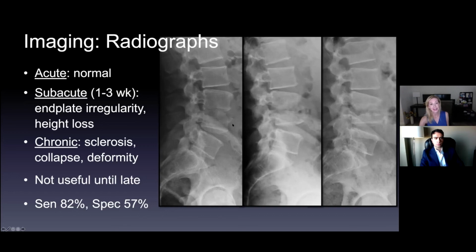So you can see, we're looking at alignment. This is the lumbar spine this time, not cervical spine. But you can see, again, alignment, well, it's straightening. We haven't got a listhesis, but it's getting straighter. This disc space is getting smaller. These vertebral bodies no longer have normal height. Getting more and more deformed, straightening out.